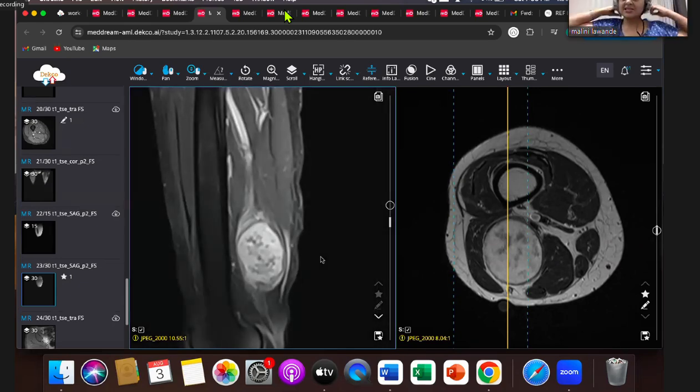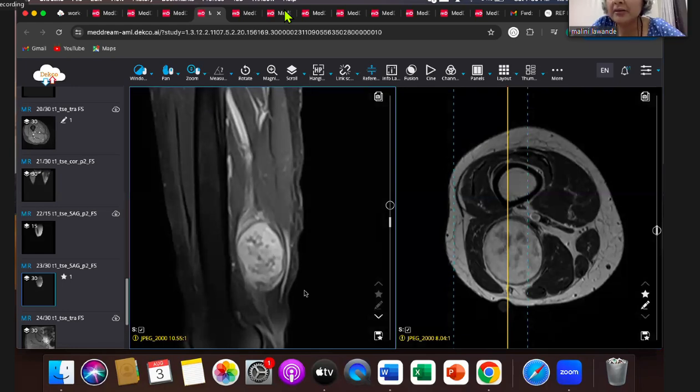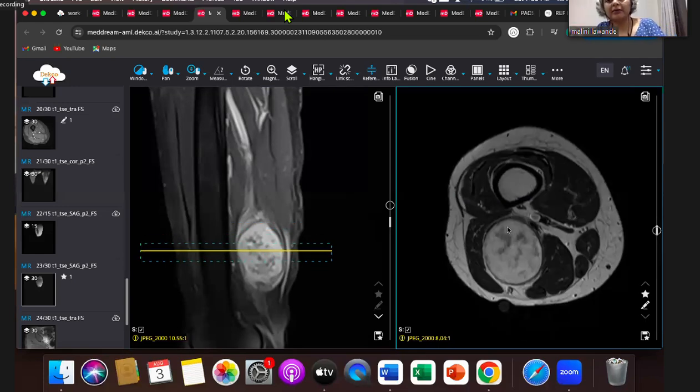So in fact, that's the reason we always put it as a nerve sheath tumor. Now, a target sign, central hypointense like this, is more common with neurofibroma. If I can see the nerve separately and this is more exophytic, more likely schwannoma. If the nerve itself is fusiform and enlarged, it's more likely neurofibroma. But it's not always possible to say. So that's the reason we will call it nerve sheath tumor.